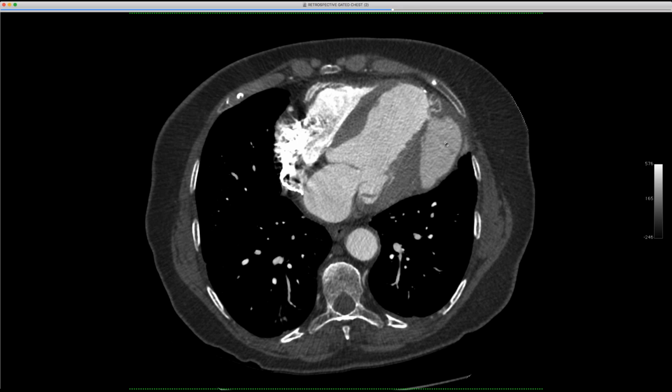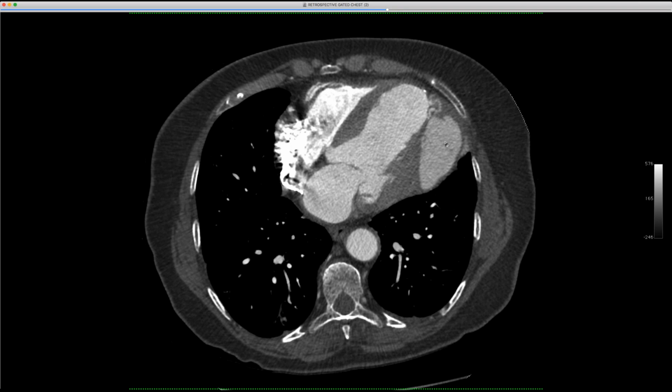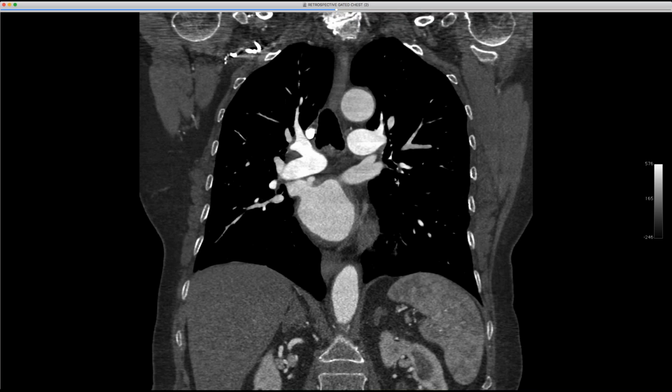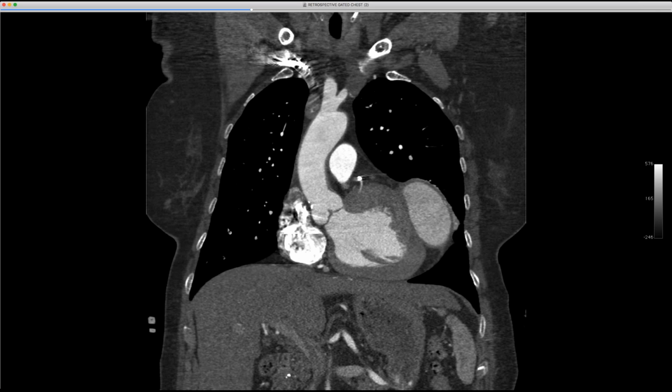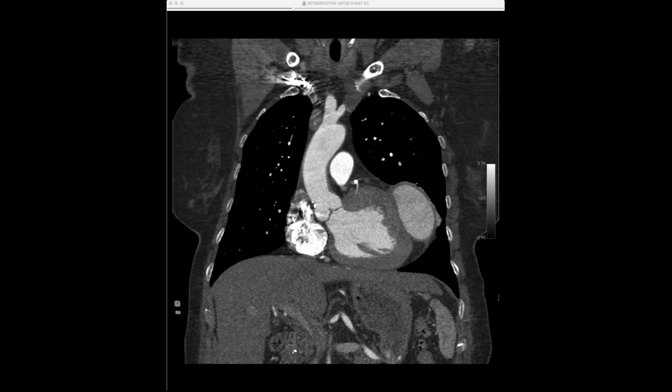Yeah. So they're trying to figure out how to repair this thing, because I don't know how much myocardium is there to work with. But it's a good example of a radiograph. I've seen one like an anterior wall aneurysm where you just get that bump. So any patient that has an abnormal heart and prior surgery, that's certainly what you have to think about, an aneurysm or pseudoaneurysm. That's crazy. Yeah, it's just a crazy one.